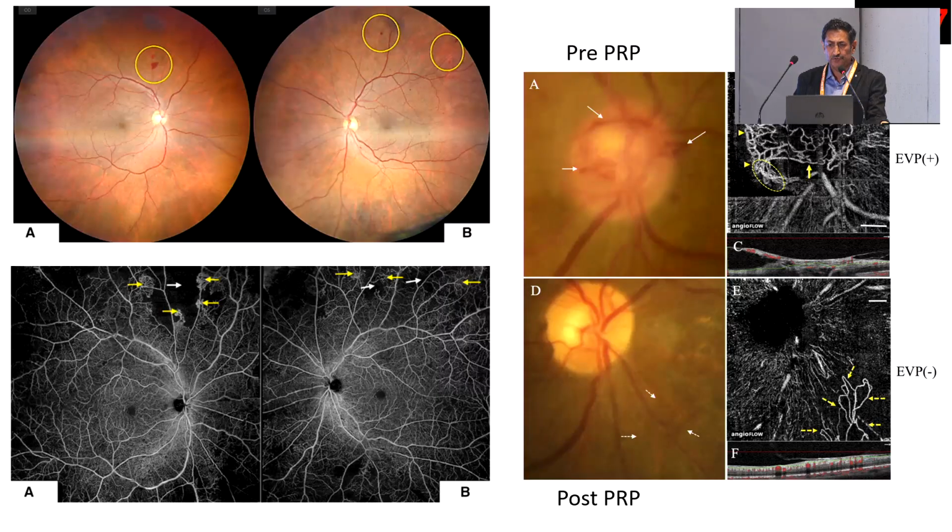And the other useful indication could be, here you can see there's a retinal hemorrhage. You are not sure whether there is a new vessel here, but if you get an OCTA, you can see the vasculature is very nicely seen. You should concentrate in this area where there is a junction of the ischemia and the normal retina. And then if you do laser, you can very well see the morphology. If you do FFA, it will just leak.